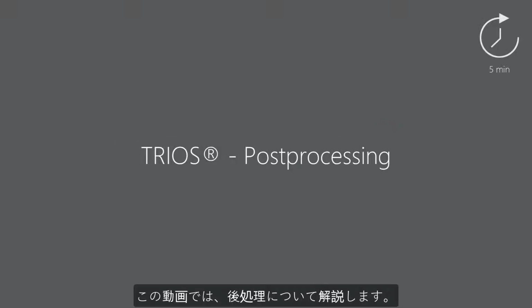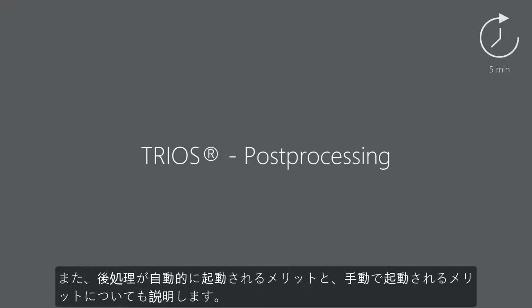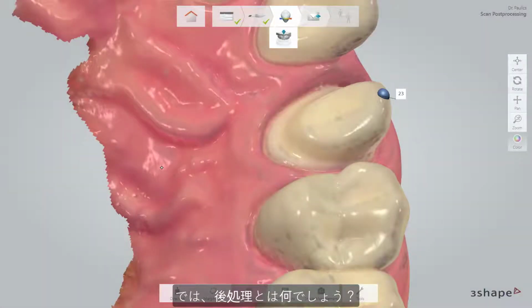In this video, you will learn about what post-processing does to a case. You'll also learn when it is activated automatically and when you may benefit from invoking it manually. So what does post-processing do?